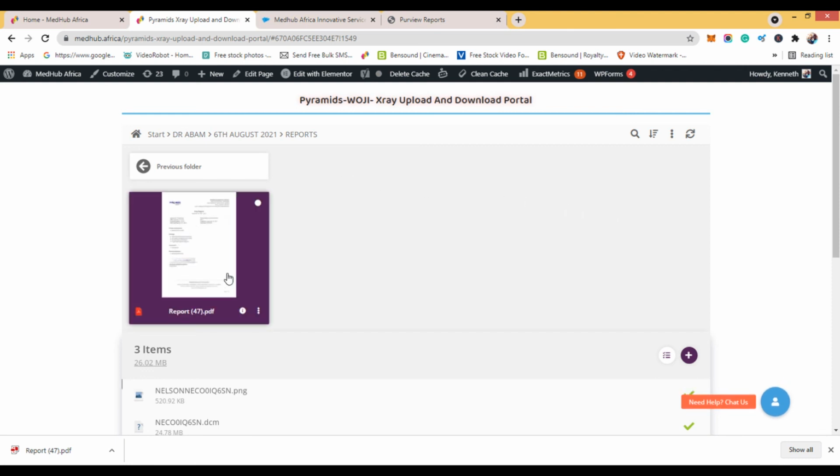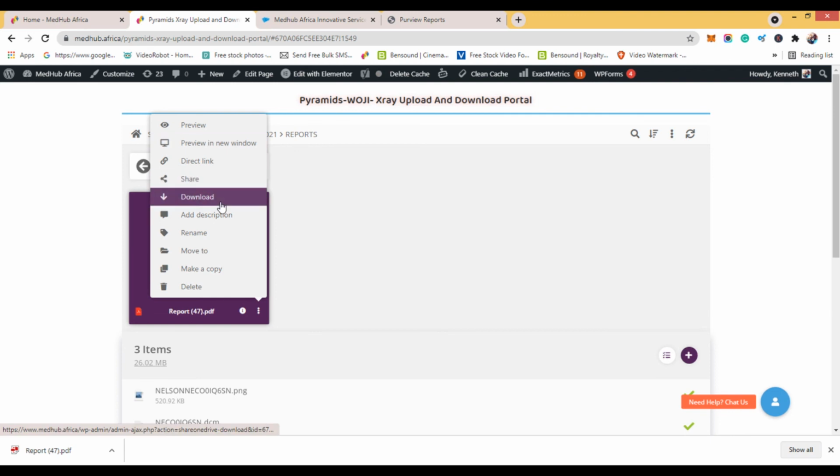The uploaded reports can be renamed to reflect their rightful owners.